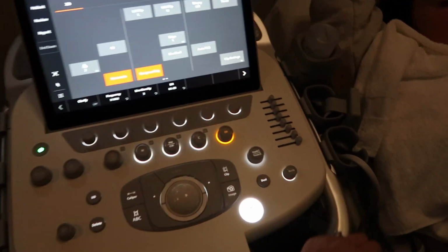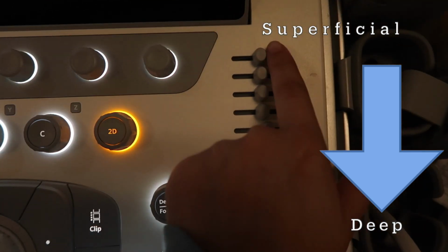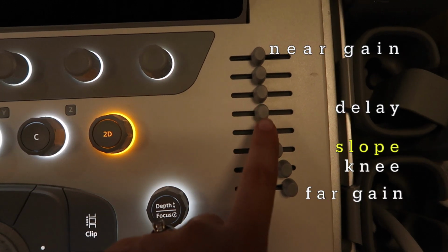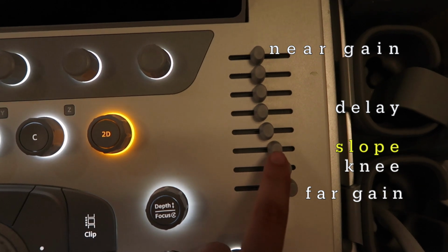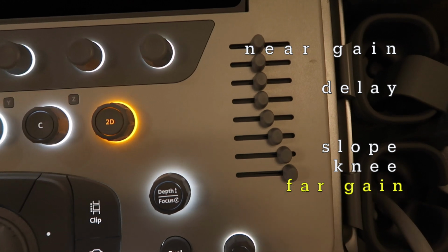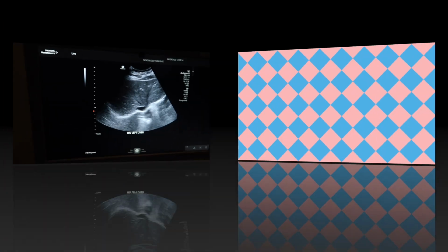Here is the anatomy of a typical TGC curve. Superficially, reflections undergo a small, constant amount of compensation called near gain. Delay is the depth where variable compensation begins. Slope is where compensation corrects for the effects of increasing attenuation that result from increasing path length. At knee depth, reflections are maximally compensated for. The far gain continues to compensate the maximum amount. As you can see, the image has a uniform brightness thanks to compensation.